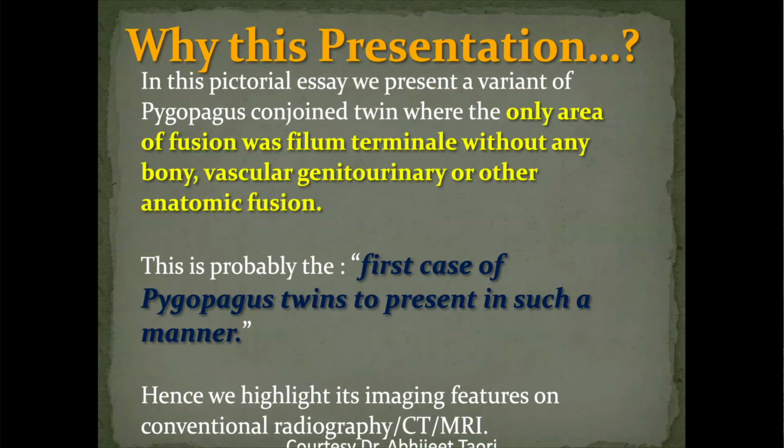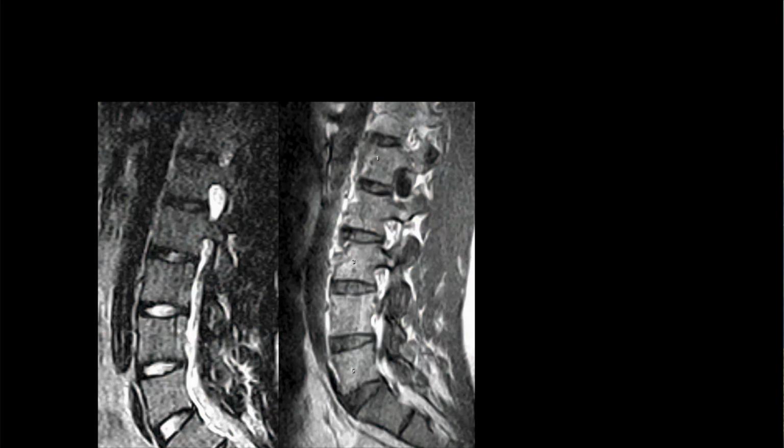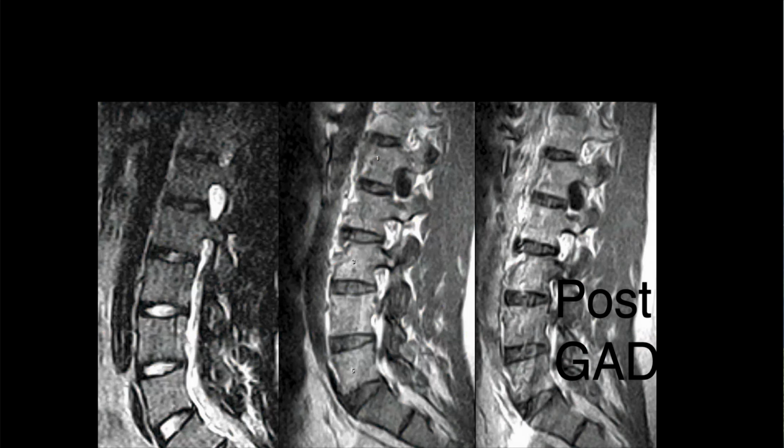Okay. All righty. Robert. All right. Here we're looking at the L spine and in the neuroforamen, I think it's at L1, there's a cystic structure bright on T2 imaging and dark on the T1 imaging. And on the post-contrast, it does not look like it enhances. So I think it's just a simple cyst.